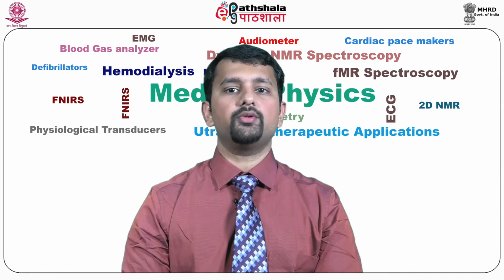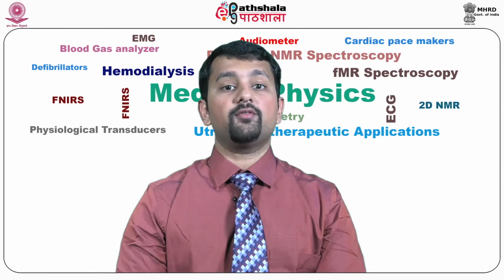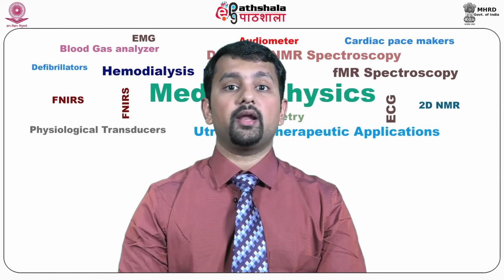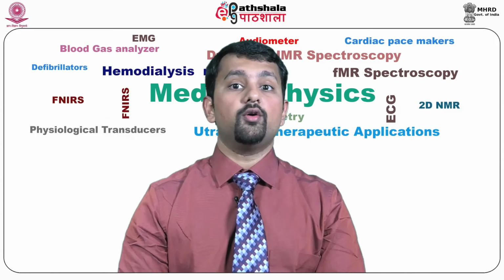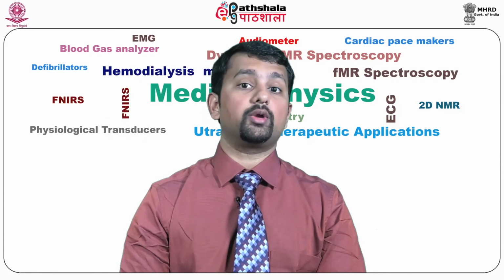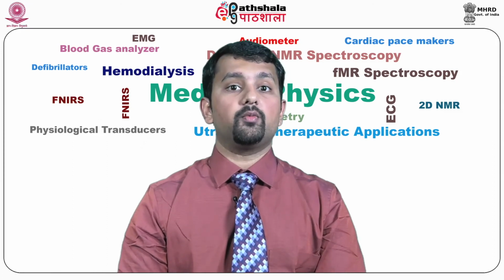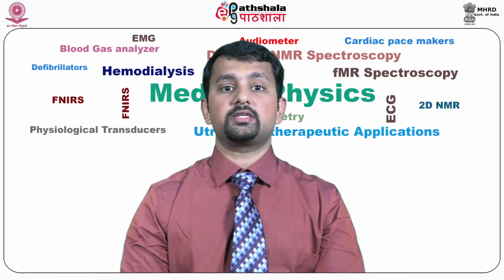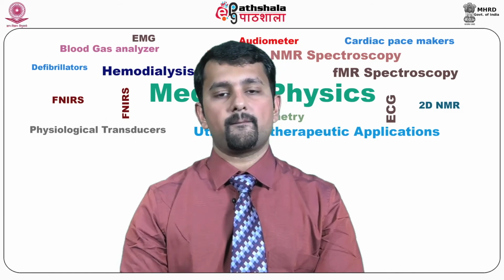Choline containing compounds occur at a frequency of 3.2 ppm. 31 phosphorus MR spectroscopy allows differentiation of peaks of choline containing compounds into phosphodiesters, thought to represent a product of phospholipid breakdown, and phosphomonoesters, which is considered indicative of increased cell turnover within the tumors.